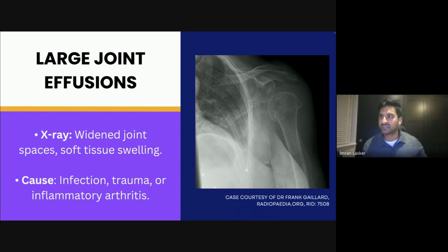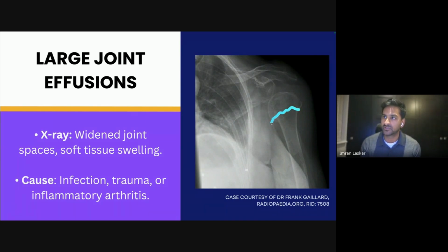Now, the space that you have, this one looks like it could be a chronic fracture or impacted fracture because it doesn't have that sort of smooth appearance. And it kind of impacts, right? It looks like it's shortened. And you can also see that the line does this and suddenly becomes like that and then comes around. And you've got this almost linear line like so. Now, these can be chronic, but it can be hard to tell on this one because you can't see a proper radiolucent line going along like so. It may be an impacted fracture.